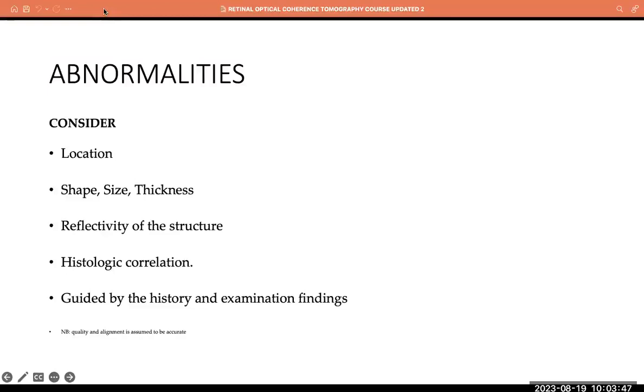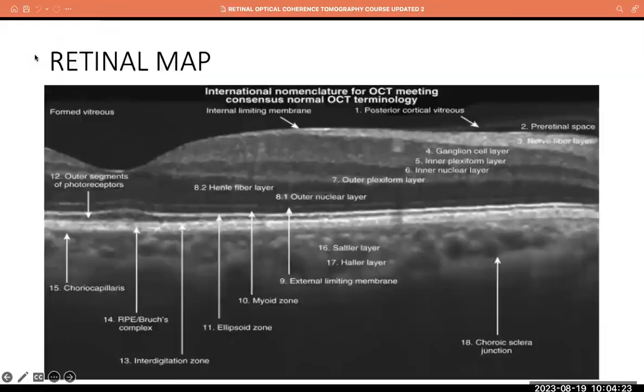So that's the clue. On the printout I shared, if the machines have different printouts, the economy of the paper while trying to print the images of both eyes on the same paper may not put the first image that shows the optic nerve head. So the retinal nerve fiber layer thickness is the clue to the eye. If both eyes are represented on the map, the thicker one points to the eye of interest.